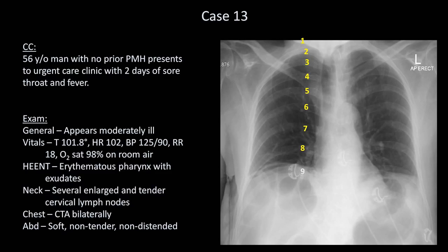There are 2 general explanations for this. First, the patient may not have taken a large inspiration, or the radiograph may have been poorly timed, or there is a pathologic process leading to reduced lung volumes. You should never assume the former unless the latter has been ruled out. Aside from the modestly low lung volumes, however, the lungs and heart are otherwise unremarkable.